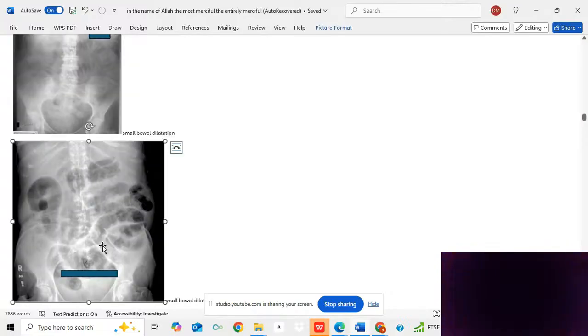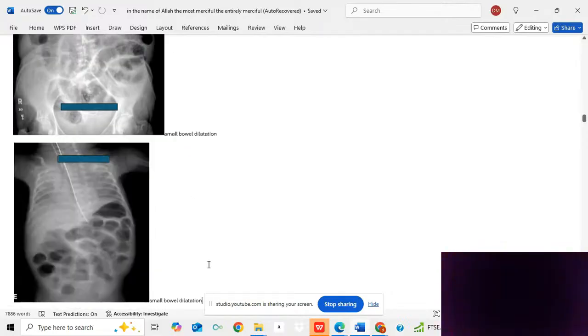Another example. Here's a small bowel loop dilatation. Okay, the valvulae conniventes, tend to be centrally located. While traversing the spine, they tend to not spare the lower 2 or 3 lumbar vertebrae.